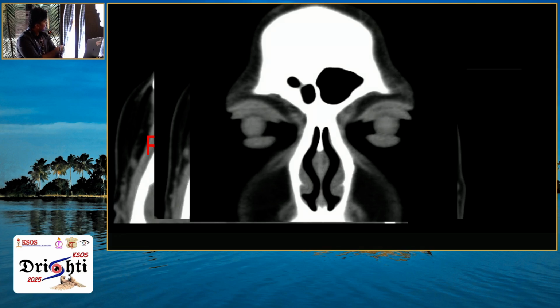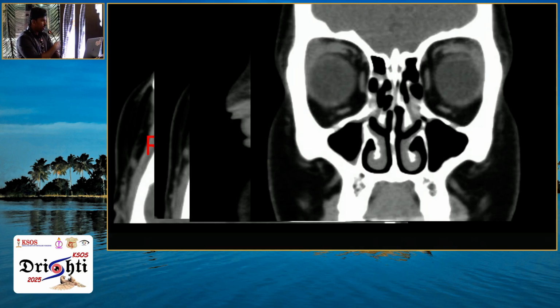And these are the eyelids. We'll go from anterior to posterior images. These are the eyelids, and these are the orbits, and midline is the nose, and here is the forehead or frontal bone. And let's go a little bit more posterior. And we have two symmetrical eye globes here, and four extraocular muscles, because we are seeing from the front. We can see bilateral symmetrical extraocular muscles, and whatever appears black in the orbits is the intraorbital fat.